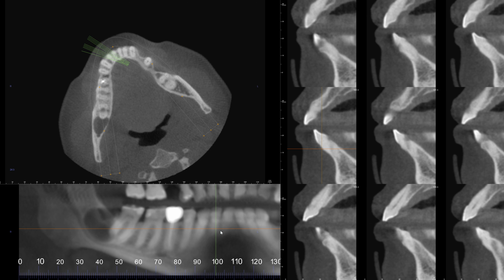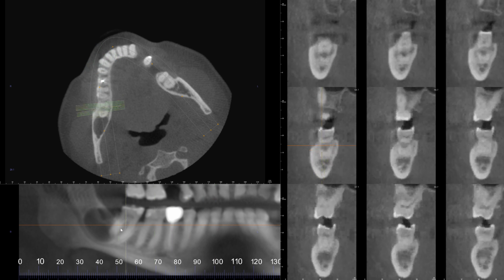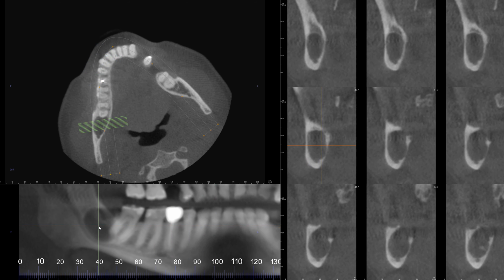So again, we don't always see ameloblastoma very frequently, and I hope if you haven't seen ameloblastoma before, here's an example. I don't exactly know whether this loss of alveolar crest has been due to biopsy. I would presume that the biopsy was done only after the scan was taken, but this is a feature that appeared to me somewhat aggressive and consistent with ameloblastoma.